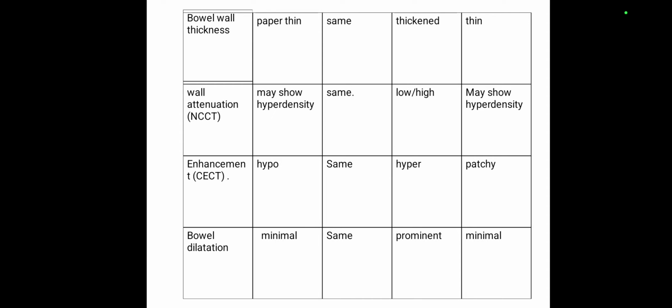Now in case of venous thrombosis, bowel wall. Now, this is in case of arterial embolism. If there is thrombotic type, the bowel characters remain the same irrespective of whether it is thrombotic or embolic. It's mainly based on whether it is arterial or venous. So arterial it's the same features, whereas in the case of venous, there will be bowel wall thickening. Bowel wall is thickened.